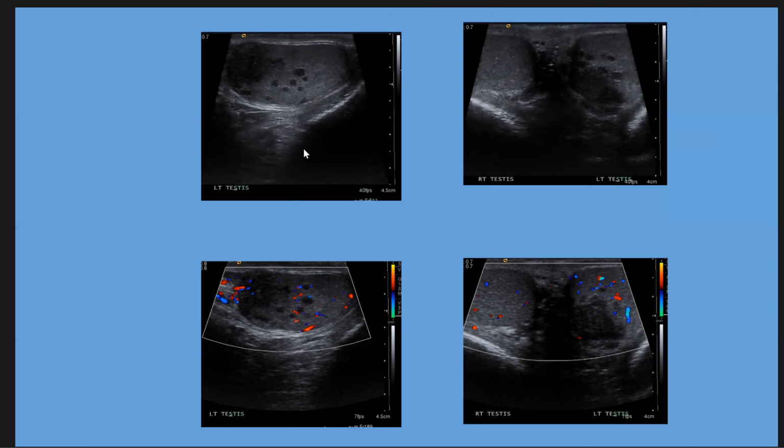We cannot exclude lymphoproliferative disease, but the patient has TB and was discharged on anti-TB treatment and improved dramatically.